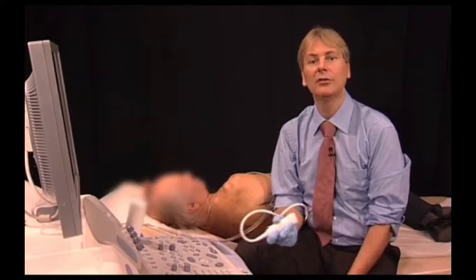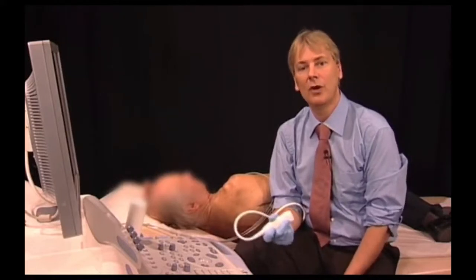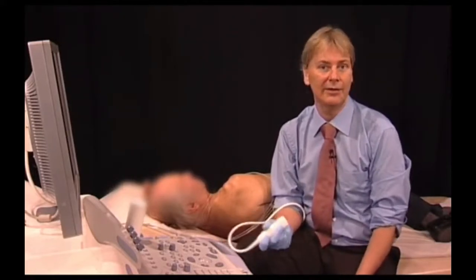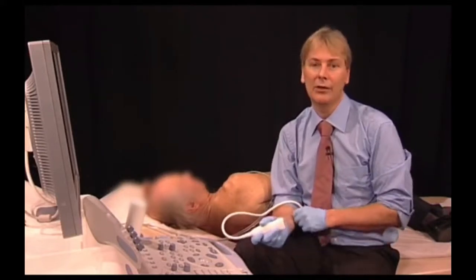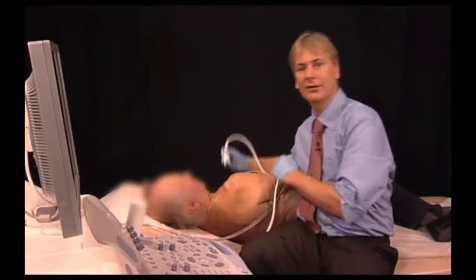Now we'll turn to an inferior infarct. We now have a patient who is 69 years old and in whom we found a scar in the inferior wall, which was found by chance. The patient never had any complaints and he does not remember having an infarct. But however, on the other hand, the patient is diabetic. So let's take a look at his echo.